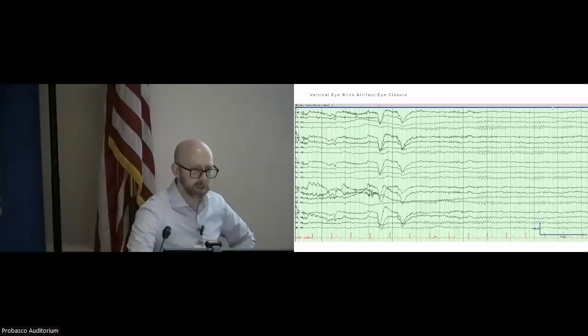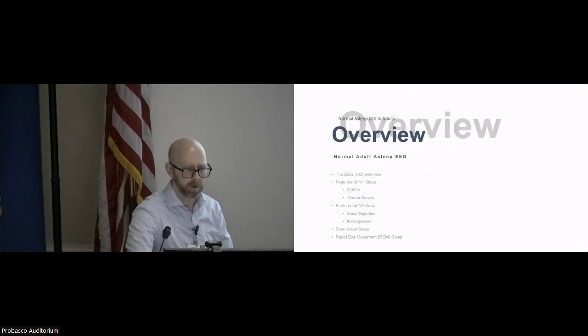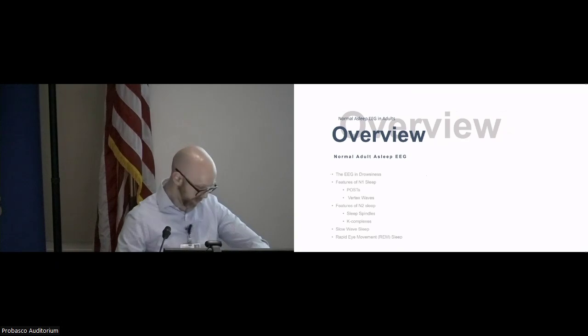So that's the vertical eye blink, eye closure again, and then you have the alpha rhythm. So that's a big concept to take away from the normal one. And we have more to come. Wait, there's more. There's more fun to be had.